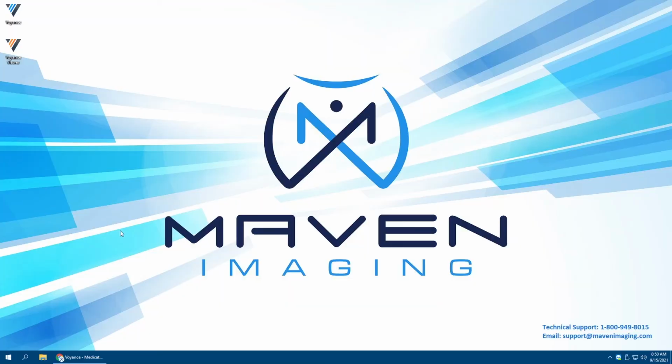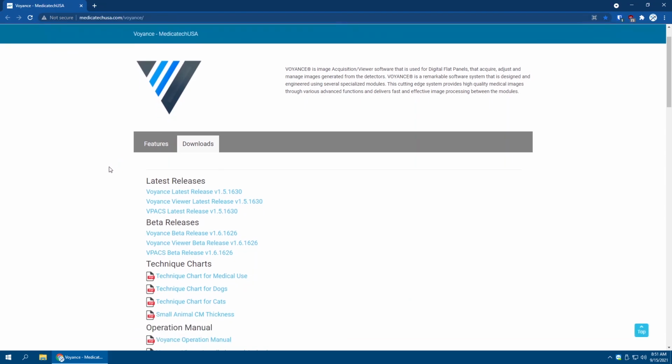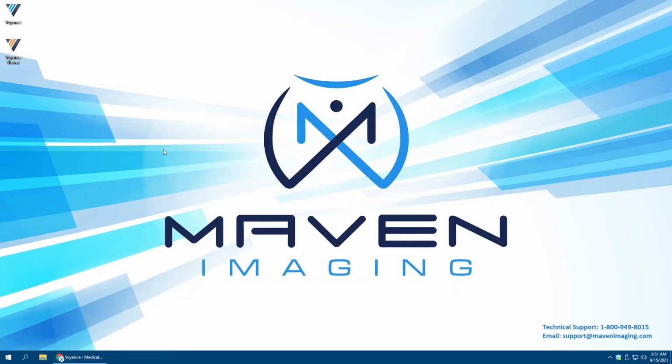So you want to be able to pull up your studies from, say, a lobby computer or your office computer. There's a version of Voyance that is limited functionality in terms of it's not the acquisition version, but you can make changes to the images and mark them up using Voyance Viewer. Voyance Viewer is usually installed by default on your main Xray acquisition PC, but you can install Voyance Viewer yourself by going to medicatechusa.com/Voyance and look for Voyance Viewer latest release.